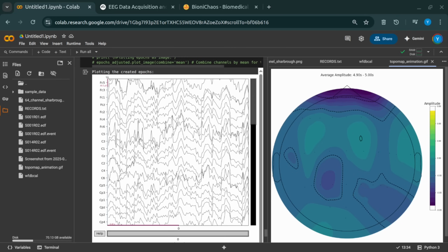We're embarking on a journey today to unpack the whole process of transforming raw electroencephalography, that's EEG data. EEG, those tiny electrical whispers from your brain. We'll walk you through the real-world challenges, the surprising detours, even some clever coding puzzles we had to solve, and ultimately create a dynamic animation that shows your brain's electrical activity quite literally dancing across the screen. It's really like seeing your thoughts in motion.